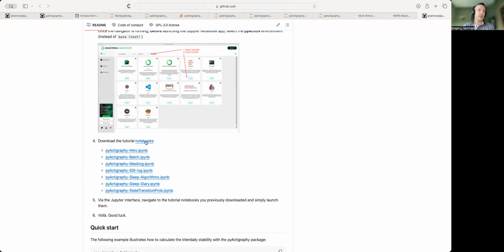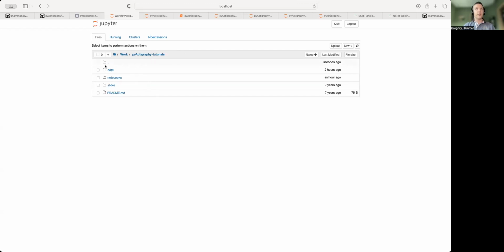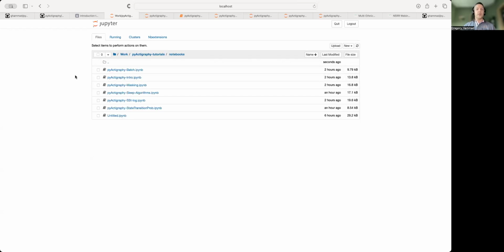If you can download, I would suggest that you download this. This is what I did. I downloaded all those notebooks. You can find them, then navigate to a location where you store them. I also suggest that you have somewhere in the directory the data that we are going to use for this workshop, so that you can easily navigate through them. Okay, so now that you have the different notebooks, I suggest that we go back to the presentation.